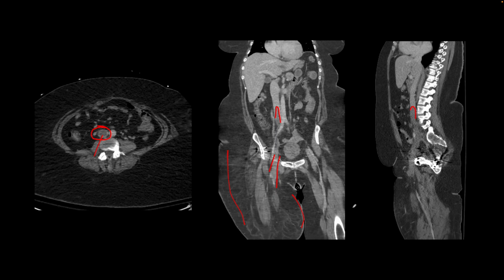And so it's important to pay attention to vessels and the opacification of the vessels and know in which phase the scan was acquired, and if it is an extremity, like I said, compare it to the other side to see if there is any asymmetry. So DVT on a CT would cause dilation or expansion of the vein, and then a filling defect inside, which is a clot.